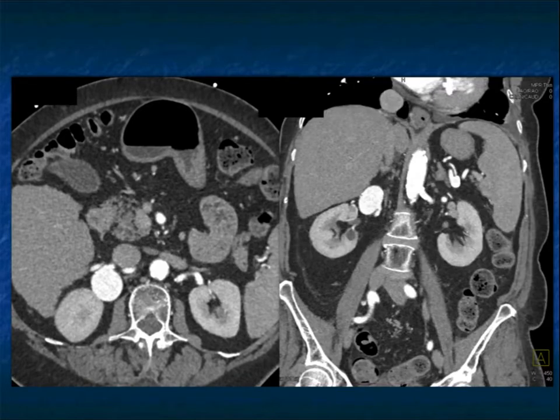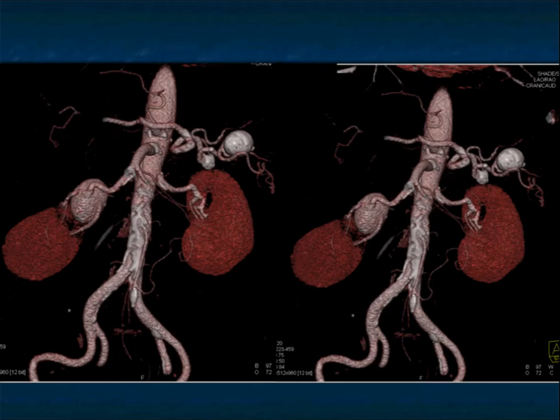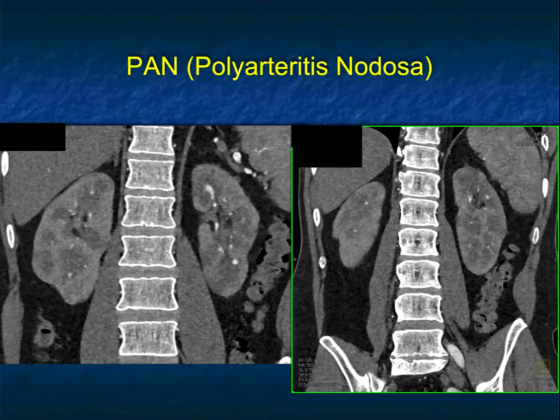Occasionally, I've seen renal artery aneurysms, particularly on non-contrast scans, simulate a renal tumor when they're more central. As we mentioned, renal artery aneurysms, look at other organs. Here's renal artery and splenic artery, the splenic being calcified. Renal artery aneurysms are less commonly calcified than splenic artery aneurysms.